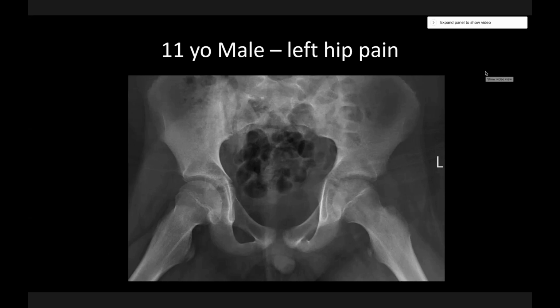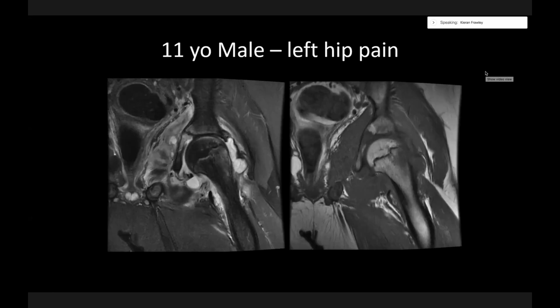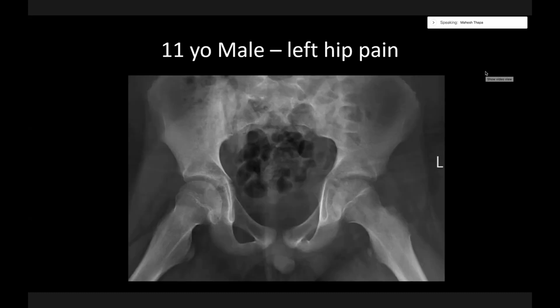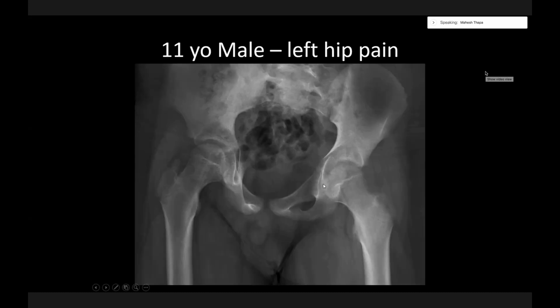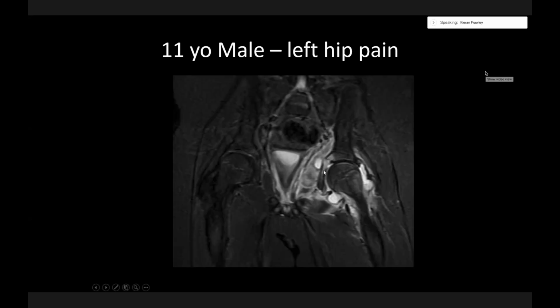But yeah, it's nice if you can pick it on the radiographs. That's a great point, guys, because sometimes we're taught to look at joint effusion on the plain films. There's joint effusion on MR, but there's no displacement of the femoral head from the acetabulum. So it looks like there's no asymmetry in the joint space. In fact, there's less joint space on the left. I find that soft tissue is really hard to interpret, and that's probably the only reliable one I find. And if you look at the X-ray, you can see why it's not displaced, because all the fluid is on the femoral neck.